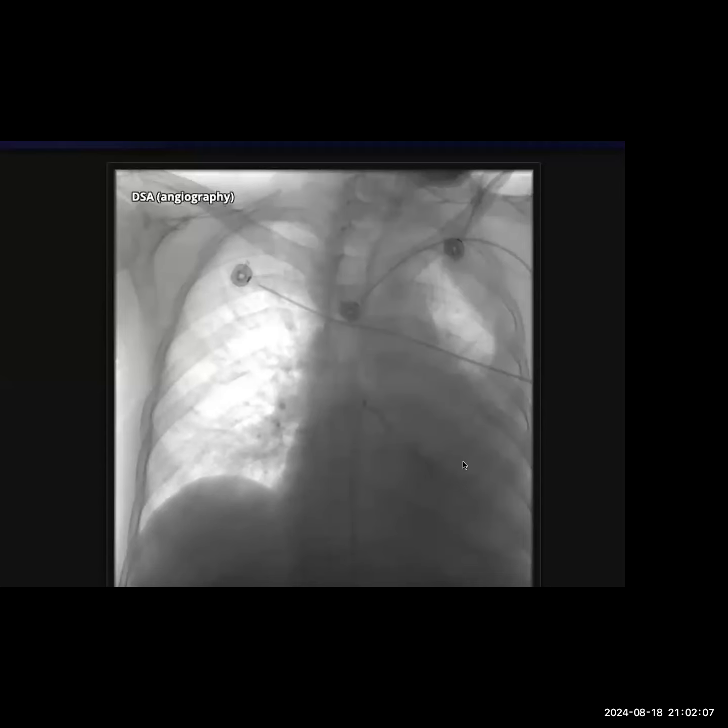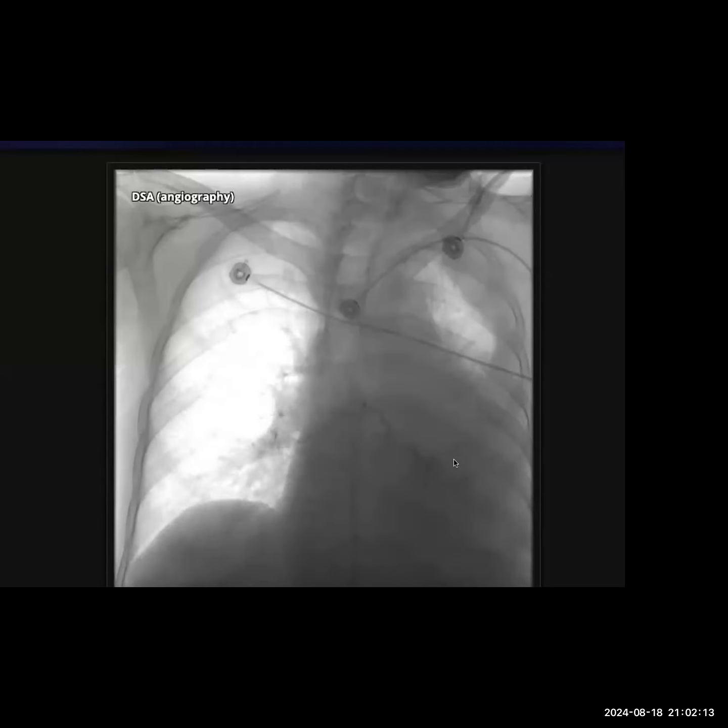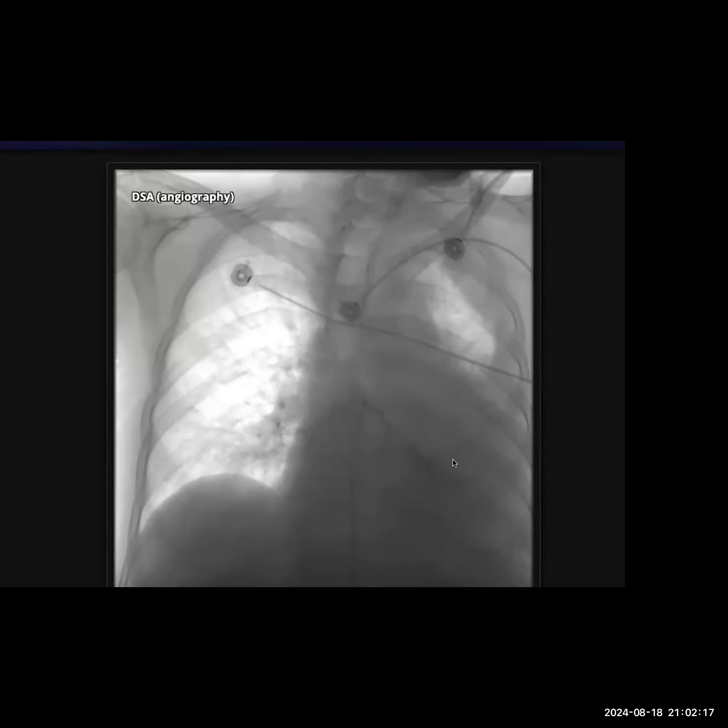If I tell you that this patient had a history of hemoptysis? Okay, with the history of hemoptysis, I'll be thinking in terms of any cavitary lesion which could cause this. With the DSA in hand, I think this could be a case of tuberculosis. No, I want you to tell me which vessel we are imaging at this point of time.